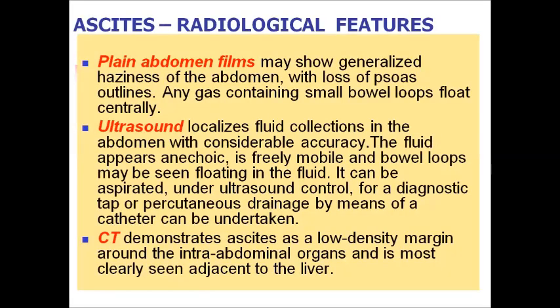Ascites, radiological features of this pathology. Plain X-ray film usually is of no use. Ultrasound may show fluid collection in the abdomen with considerable accuracy. This fluid appears anechoic. It is freely mobile, and bowel loops may be seen floating in the fluid.